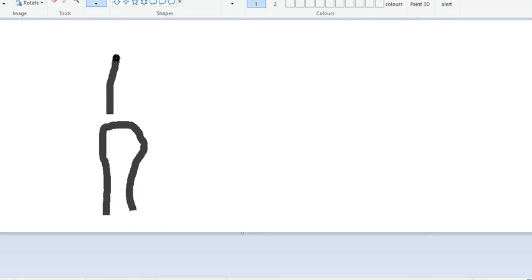And earlier I was talking about rotational errors of the finger. Expect to see something a little bit like this in the DP, where there's some curvature of the phalanx bones. One side's going to be quite flat and the other side's going to be quite significantly turned. It's more an oblique view, as you can imagine. This is not the view that we're trying to go for.